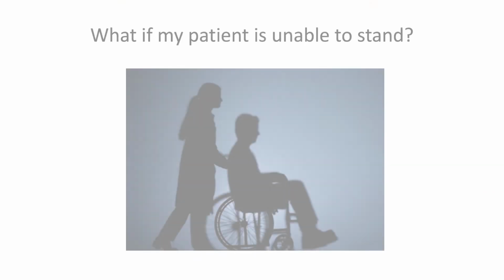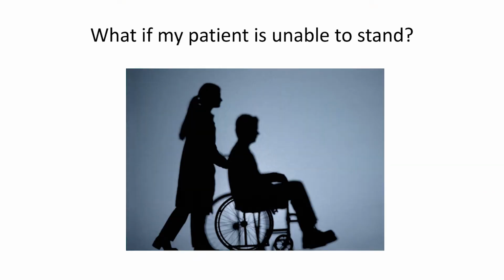And if your patient's unable to stand, you can try to do them while they're sitting in a wheelchair, as long as it's not one that has the headrest on it, because that will get in the image. So if they're able to transfer over into any other type of chair that still has a back on it, then you can try to do that. If it's just like a rolling chair, I would suggest putting some sort of padding under their rear end so that they're up a little bit higher, because otherwise sometimes the back of the chair can get caught on the pan machine as it spins around.